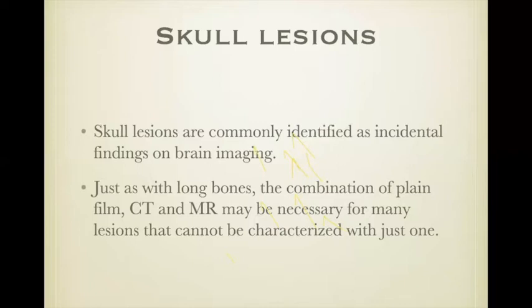Now, these skull lesions are commonly identified on imaging, but just as with the long bones, this benefits from a combination of using CT and MR in many cases to determine the nature of these lesions.